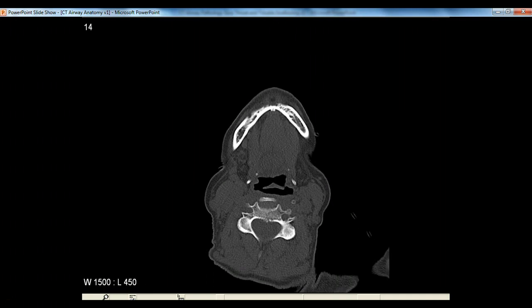And now, in the midline, you're now into your pharynx. That's the black open airway space. And air and food and everything you drink cross in that space. And so that's a very busy space, and you coordinate quite a bit to make sure that things don't go down the wrong tube: the esophagus, which lies posterior, or your larynx and trachea, which lie anterior.